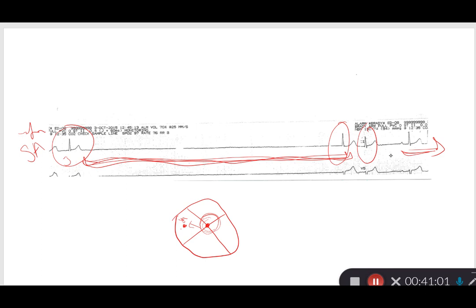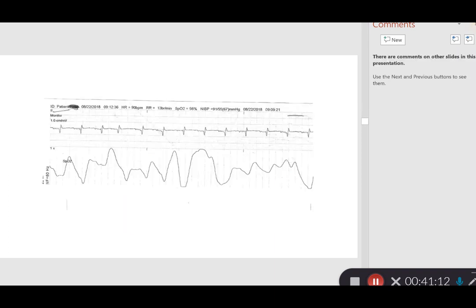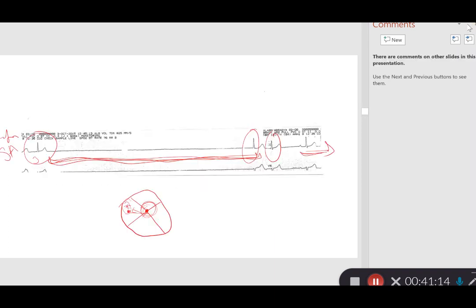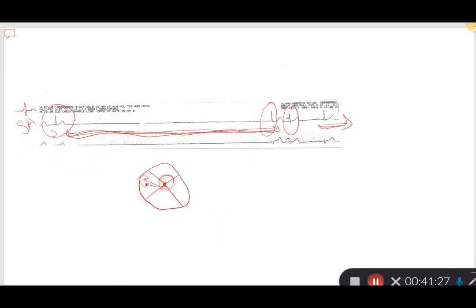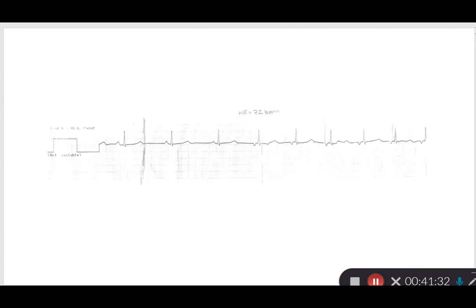This is why we have different pacemaker sites in our heart. If my SA node fails, my conduction system is going to move to the AV node. And then if the AV node fails, then the ventricles are going to pick up and start conduction. So it is kind of our fail-safe mechanism. So just a very interesting rhythm for that patient.